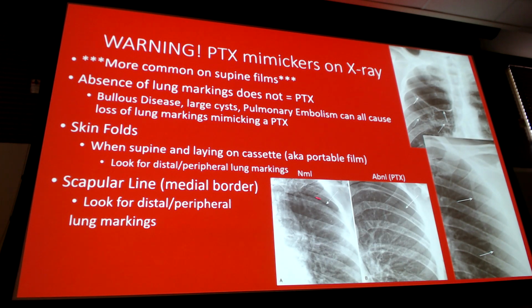This line that I'm seeing is in the shape of the thorax. Never mind, it's more radiolucent as opposed to radiopaque like the pleura. Focus more in, I see that shadow, I see that line, I have lung markings superior and lateral to it, that is not a pneumothorax. But this one, I don't have those lung markings. So I got these side by side so those skin folds don't trip you up.